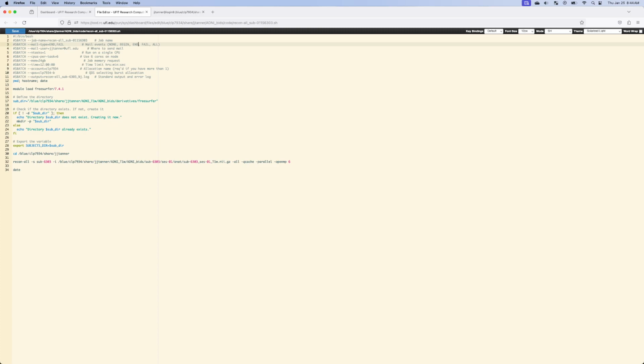And that's okay if you're just running one or two things, but I've accidentally left that on before. I had an all in there and I'm running like 200 things. So in a short period of time, I get 200 emails and all these things. And it's kind of a little bit of a hassle to deal with for a little bit. But so end and fail, usually when I do it, I just do fail, but for our purposes, I would recommend you having end, so you'll get a notification when it's done.